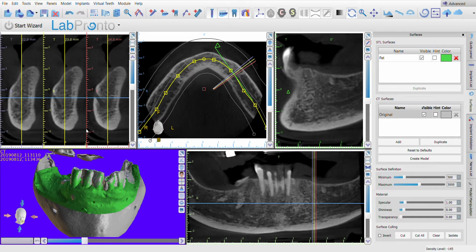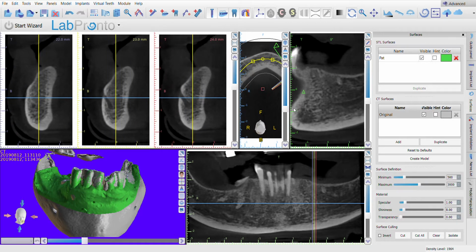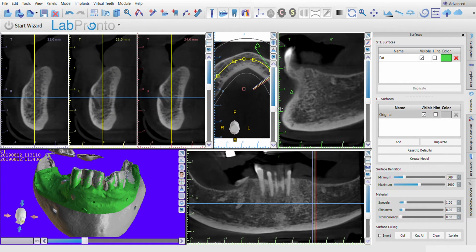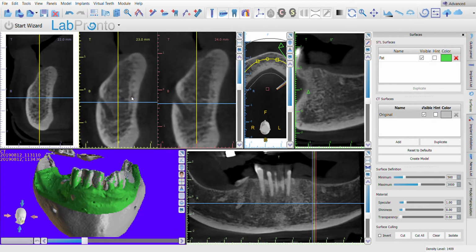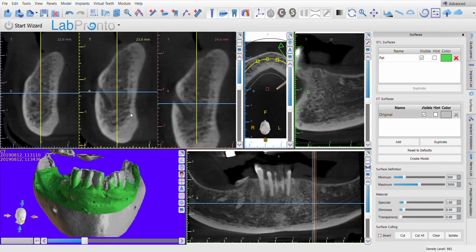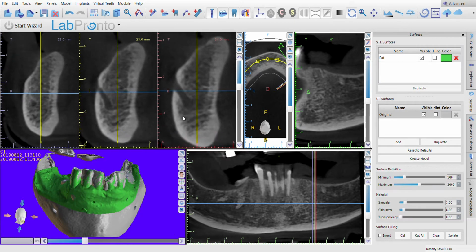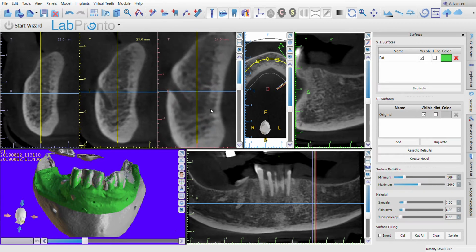If you want to enhance your image, or if you want to see much bigger, you can always get rid of one window, make the other one larger. You're not completely getting rid of it, but you're able to basically make everything bigger. And the way I make these larger is basically, as I said in the past videos, use a mouse, right click, closer to you gets smaller, away from you gets larger.